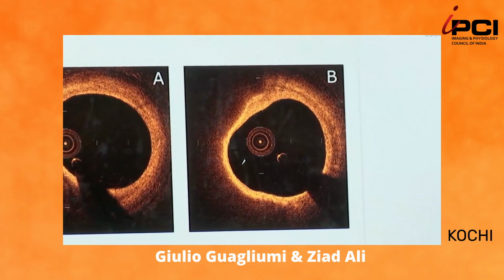Let's say the EEL versus lumen. But there are no patients with only EEL, or a patient with only lumen; there is a mixture. So what should be done? Safe here, safe here. What do we need to discard in terms of landing?